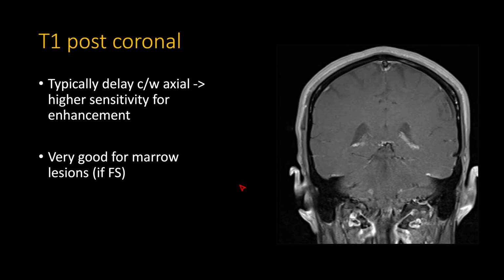So I think this was a nice brief overview of a routine search pattern. Again, this will not cover specific MRIs, high resolution MRIs done for specific purposes, but it is a good general purpose search pattern to use.